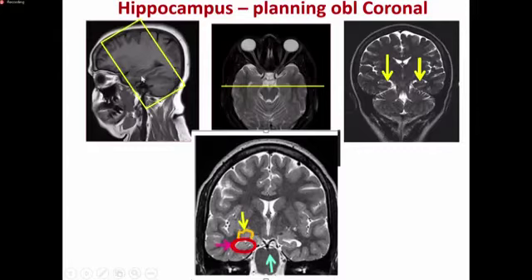In your sagittal, look at the long axis of the hippocampus. The most important sequences will be your high resolution coronal T2 and a coronal 3D SPGR. Now, you need to plan sections perpendicular to the body of the hippocampus. This information will be useful for beginners who are yet to start practicing MR. And you need to check in the other two planes correspondingly.